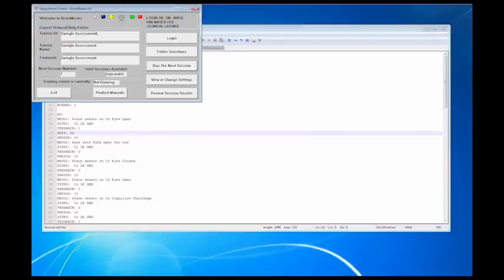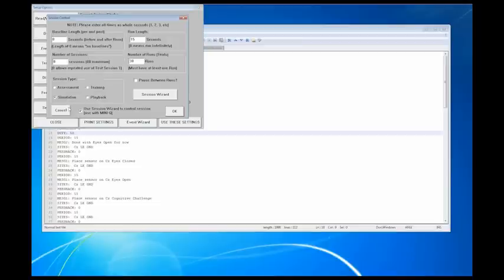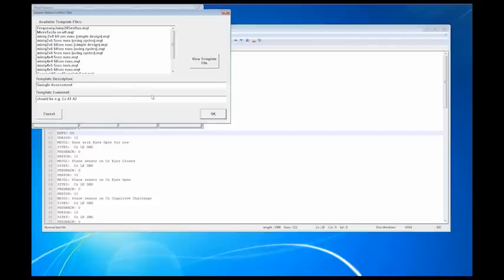I'm going to go back to my BrainMaster 3.4 software, which I should update. I know I'm going to get yelled at by you guys because I tell you guys to update all the time, and I'm running 3.4 right now. Use SessionWizard to control. Click the SessionWizard button. I'm going to scroll down, find my Swingle assessment, click it, and reload it.